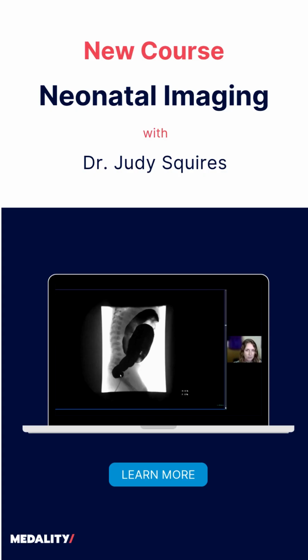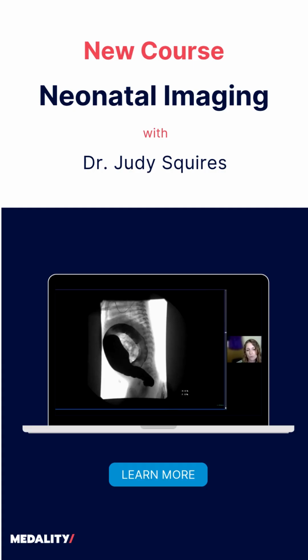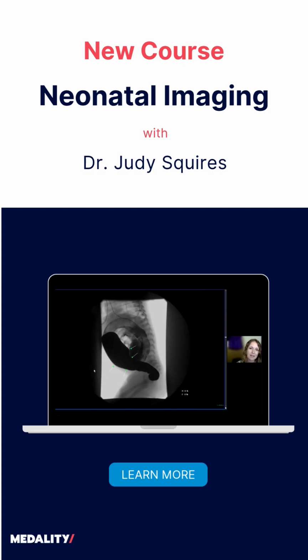Again, we are making sure that this never opens up and it's continuing to be abnormally narrowed here. Patients with Hirschsprung disease can be challenging to get that contrast to reflux all the way to the proximal ileum. But as this case is, this is a case of Hirschsprung disease with abnormal rectosigmoid ratio and dilation of sigmoid colon upstream because of that aganglionic section of colon.